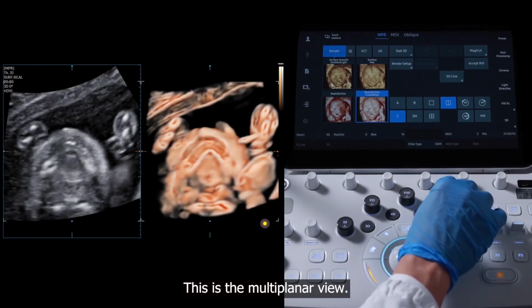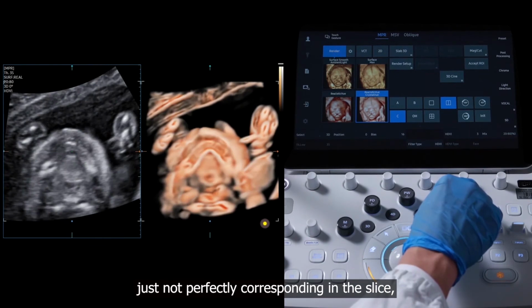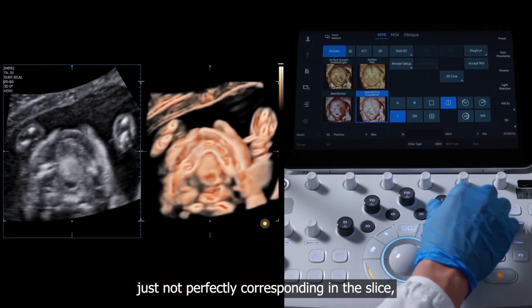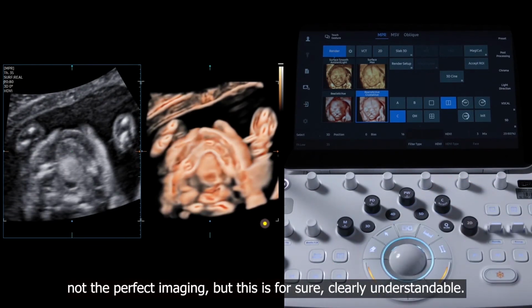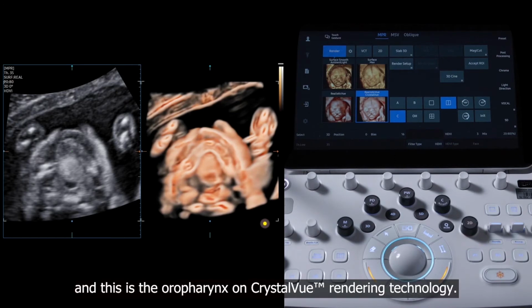This is the multiplanar view, which is best visualized here, just not perfectly corresponding in the slice, but it is for sure clearly understandable. This is the oropharynx on multiplanar view, and this is the oropharynx on CrystalVue rendering technology.